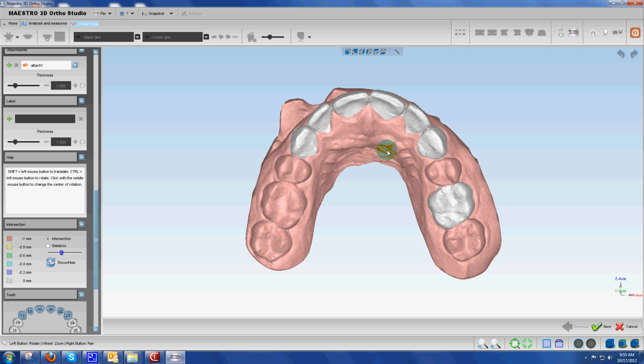There were some specific reasons why we chose to define and select the teeth that we did. And just to repeat that briefly, it is my intent to reposition the four upper incisors. The canines are sitting here strictly as a firewall to prevent any undesirable morphing of the rest of the anatomy that is shown here in brown. And obviously, the first molar is here defined for the purpose of being able to put the ID numbers on the models that are potentially going to be printed.